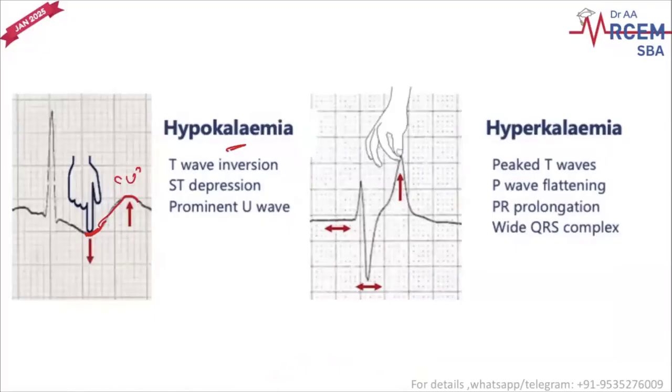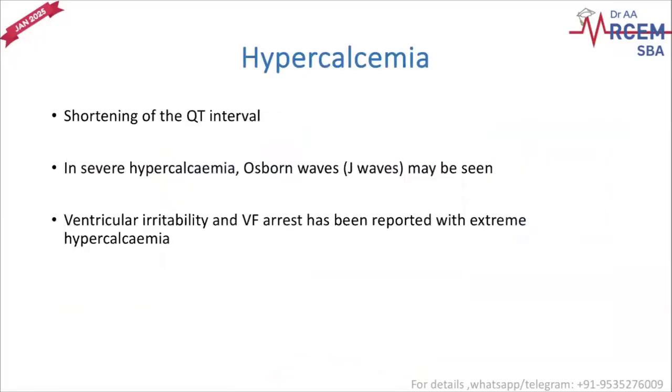This is hypokalemia. It's like someone is pressing down. In hyperkalemia, someone is pulling the T wave up. So a tall peaked T wave, along with an increase in PR interval and broad QRS complexes, are seen in hyperkalemia.